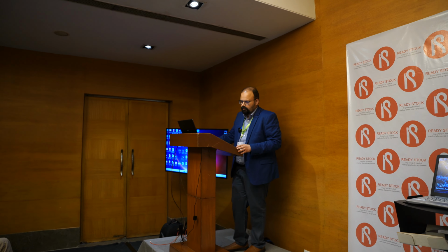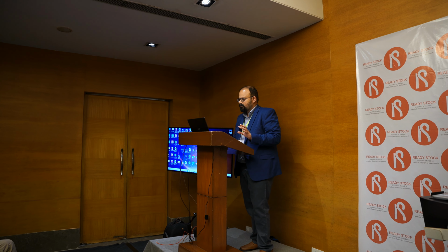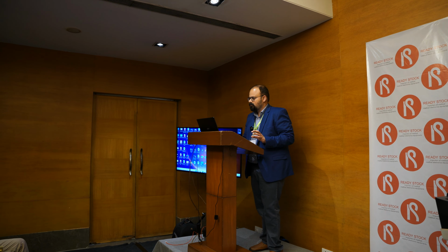So the London classification, what it does, it simply gives a very simple method on how we should be classifying our anorectal disorders. So let me start with a basic video on, first of all, how we should be doing it.